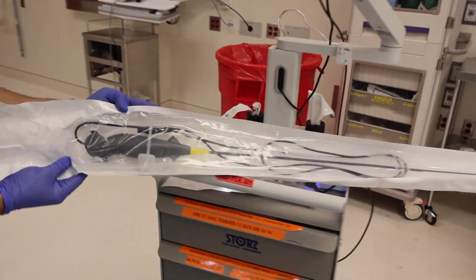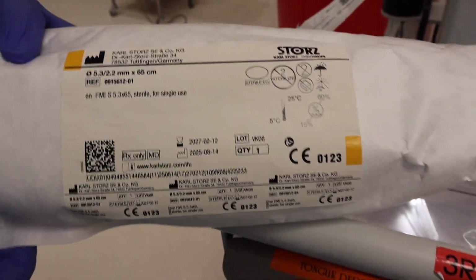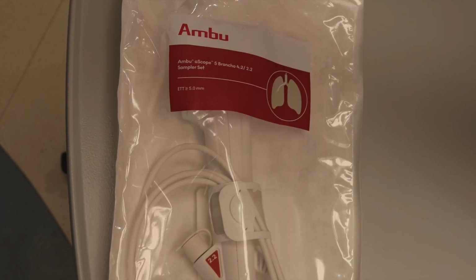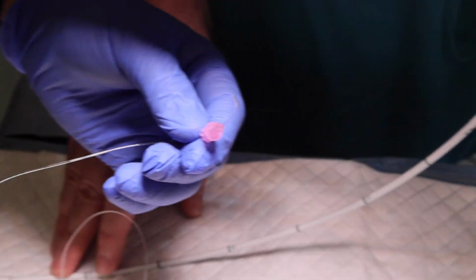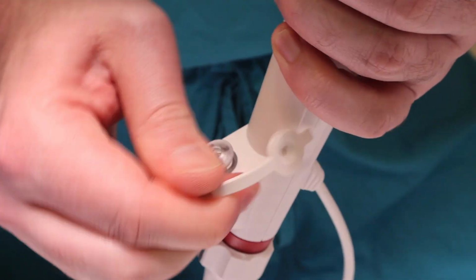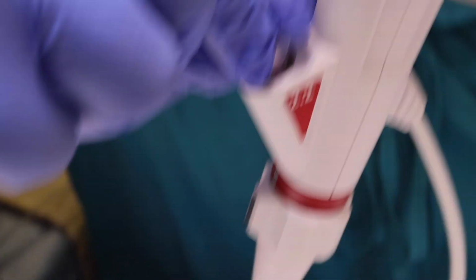Your fiber optic bronchoscope and tower should be defogged and tested. Options include either a stored scope or an Ambuscope with tower. We use the red Ambuscope for our demonstration since the size works best with our available epidural catheters. A 20-gauge epidural catheter should be threaded through the suction channel for the spray-as-you-go technique.